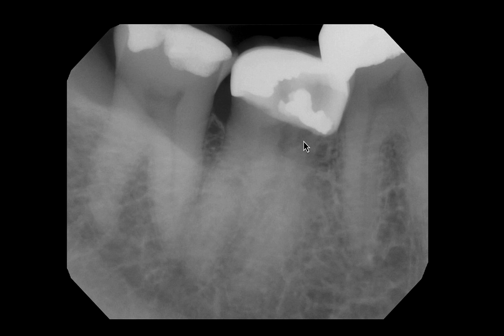How long has this been there? It's probably been there a solid 65 years, right? Or a 12-year molar. So, 60 years anyway. And it wasn't until a dentist got a three-dimensional view of it that we started worrying about it. I think he's probably going to be okay for another 60. So this is absolutely not something I think we are justified in treating.